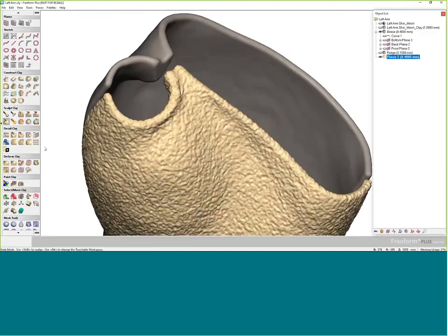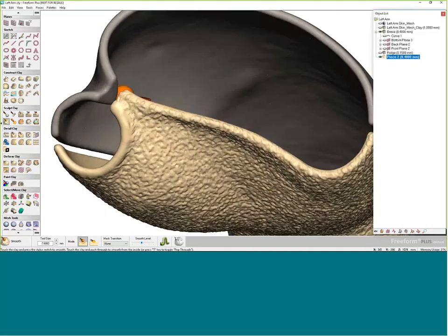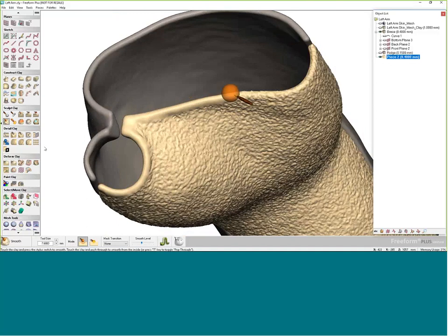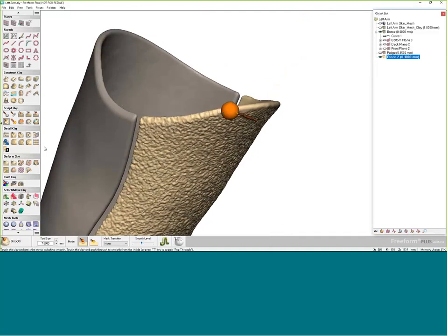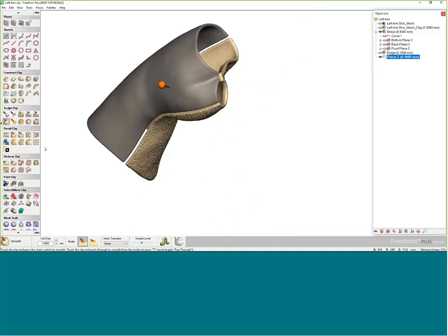But we don't want to have that in the thumb or in the finger area, so I'll go ahead and smooth this area out. So this guy has no problem using this brace. I'll just go along this ridge and make a nice radius here, or a nice smooth edge. And I'll do that on the forearm part also. All right, that's pretty nice. All right, so we'll move to the top part of the brace.